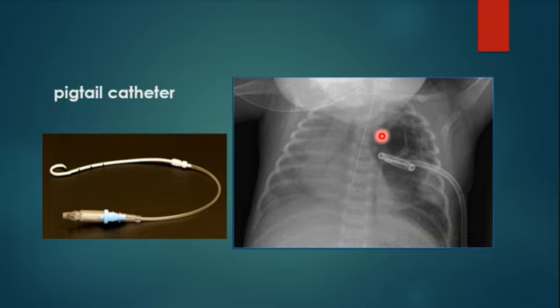One of the types of chest tube is called the pigtail catheter. This type can be a very helpful technique, especially for a pneumatocele, just like in this case, in small effusions, and sometimes in pneumothorax, especially of low content. The important thing is that it can provide a fixed site, it does not move, and it can be placed easily. It cannot be pulled out unless there's a specific technique where they open it and then extract it outside. So this is called a pigtail when used.